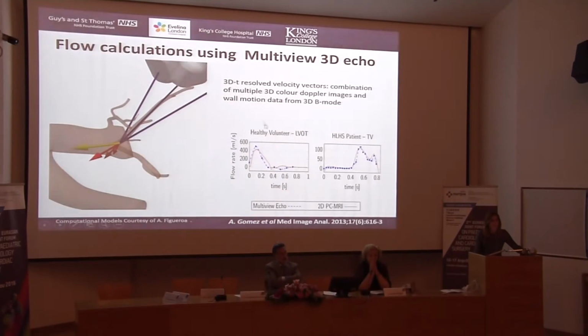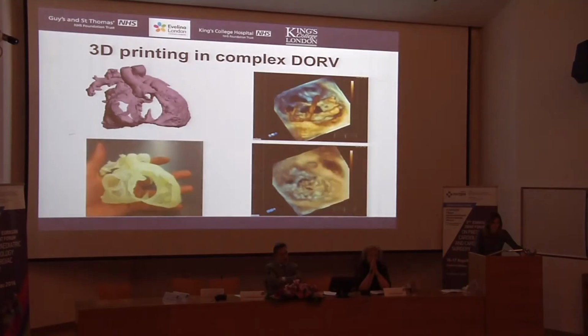Now, the benefit of doing this is for small children. If this flow assessment is as accurate as MRI, then we don't need to have general anesthesia, and then we can have better quantification of all the congenital heart disease problems.